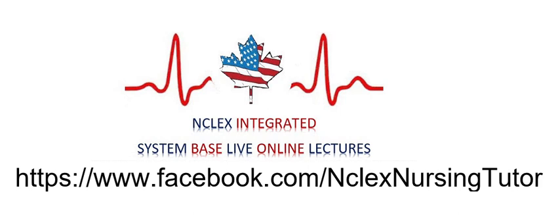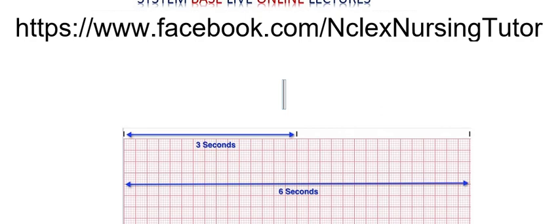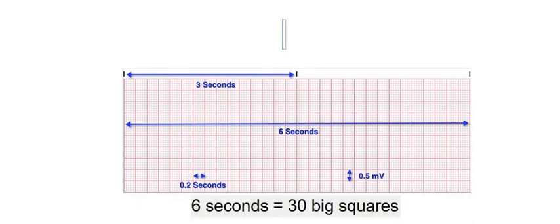What I mean about that is we need to look at this. Let's jump into it. So you need to know about this EKG grid. If you don't know about this grid, then it's time for you to sit down and relax and watch the video and learn about it. If you ask many of the nurses who are working right now, who already have their license and are working on the surgical floor, medical floor, about EKG, they might not remember the grids. They might not be able to tell you about the QT. They might not be able to calculate it.